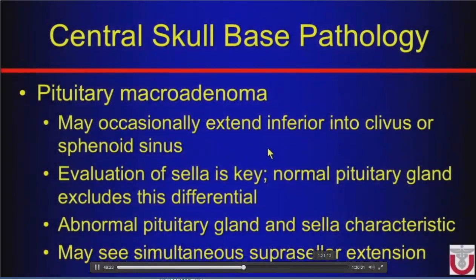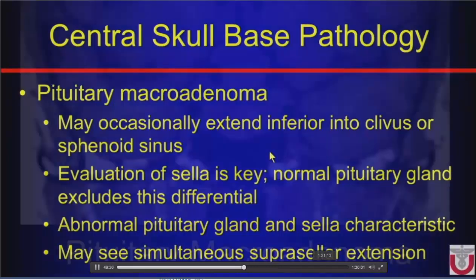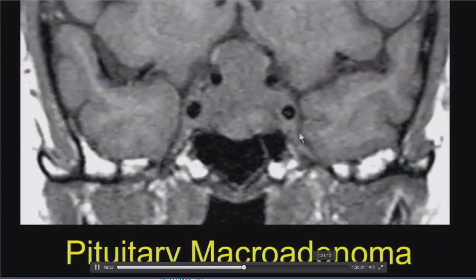Next we have macroadenoma. So normally with a macroadenoma, path of least resistance is going to be up, soft squishy brain, not down into the central skull base. So normally we look for a nice snowman shape of a lesion there at the sella turcica, the Turkish saddle, where the pituitary normally lives. And we see it extending up, and we think about that diaphragma sella that's supposed to be intact over it. So even if it's pushing that optic chiasm way up high, they can still go transsphenoidal and suck out everything and pull it all down because that diaphragma sella is supposed to be intact.